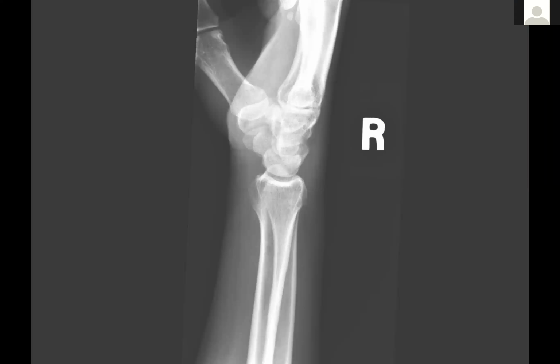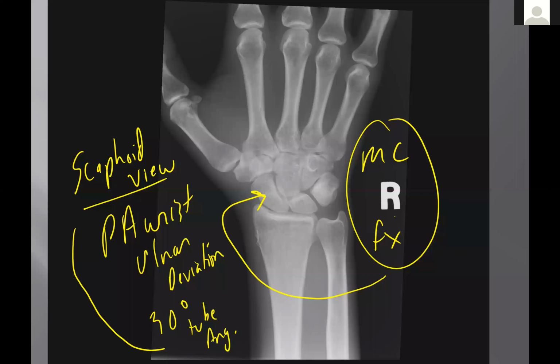Yeah, that distal radius, though, that wouldn't need anything more than just letting it heal, would it? Yeah, that's a great question. Because there's no displacement and hardly any angulation, they'd probably cast it because it's a big bone and it's impacted. It's impacted, I can tell, because of the sclerotic bone right there. And so it's squished together.